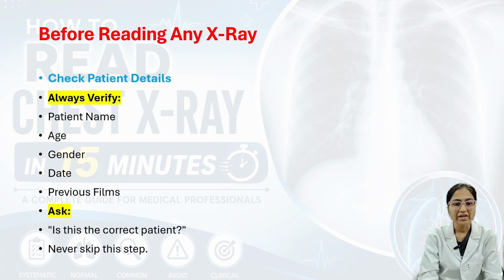Before reading any X-ray, we need to check patient details. This is a must. Always verify patient name, age, gender, date, and previous films, and you need to ask, is this the correct patient? Never skip this step. This step is very important.